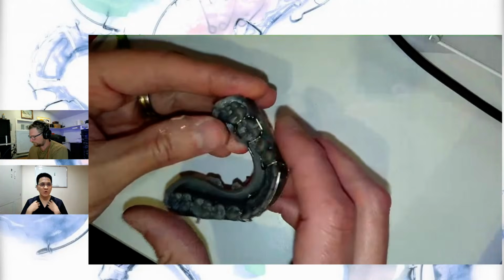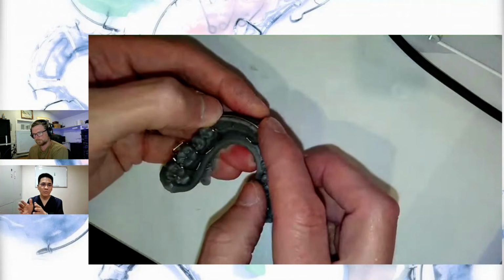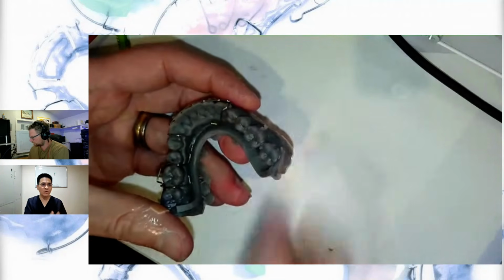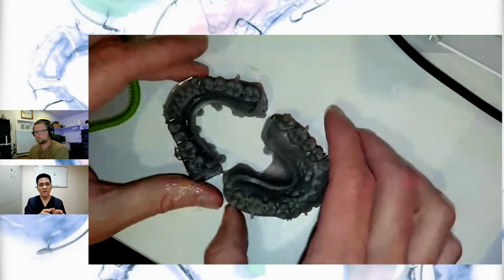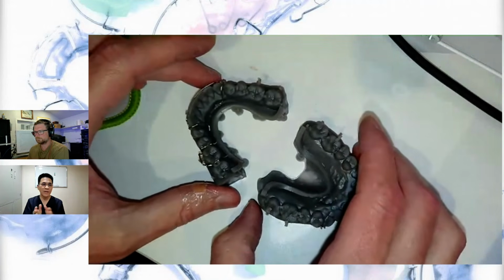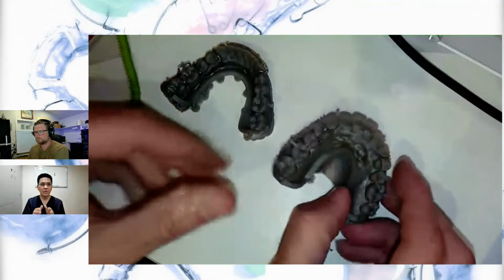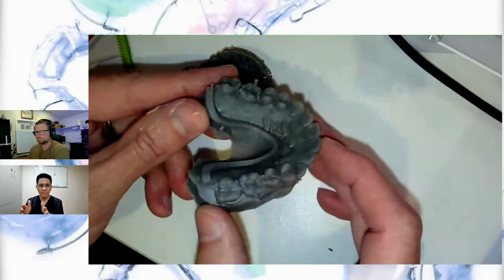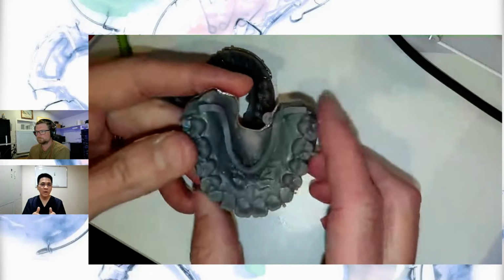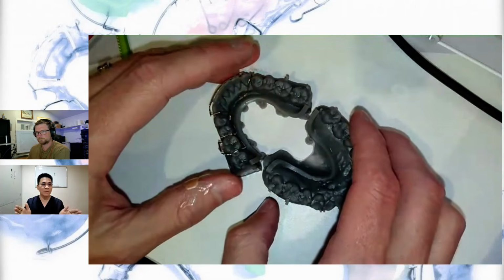Yes, because I'm an orthodontist. I design the software not only for labs, it's also for orthodontists. So I finish my case, use my software to do the cephalometric analysis and the model analysis, and do the planning in my software. Also in the future, our software can do the marking for bone expansion.